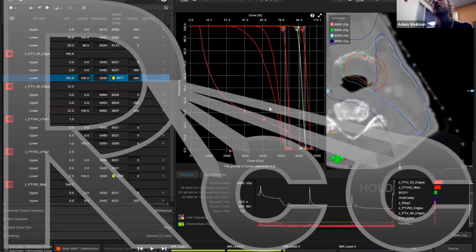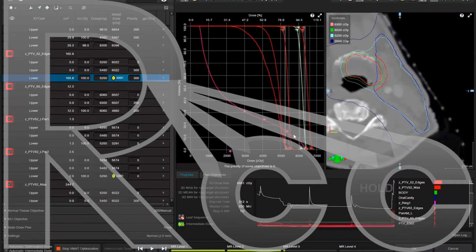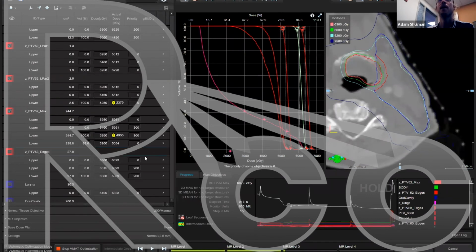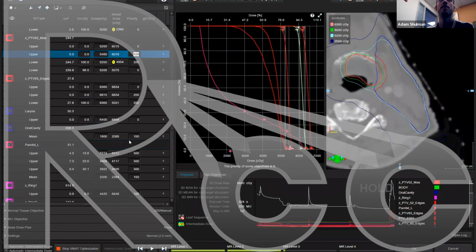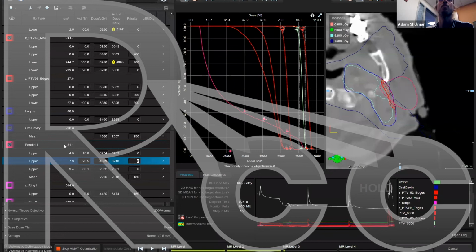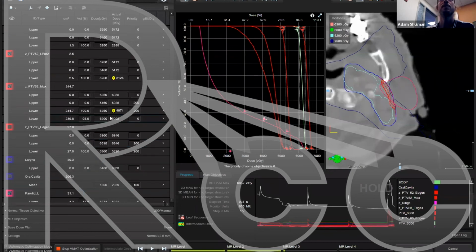And so we've almost got coverage, but look, my parotid hasn't moved. Okay, let's go back. And let's pretend I don't put, I'm going to try and exaggerate this. Let's not lock this down. If I exaggerate it, it becomes much, much worse. But anyway, we'll just do it here.